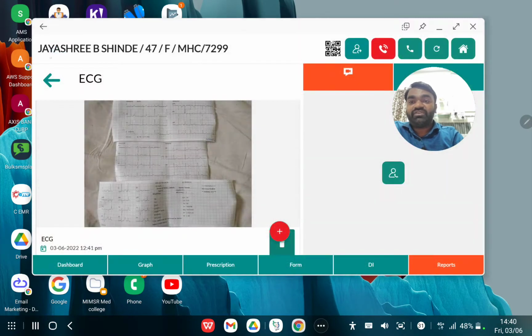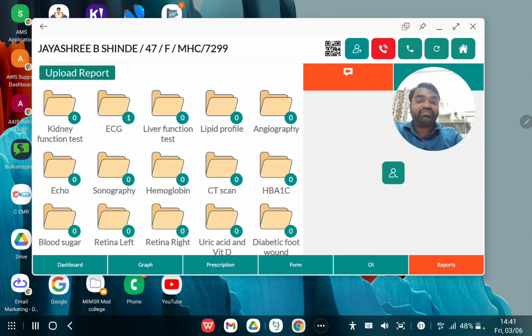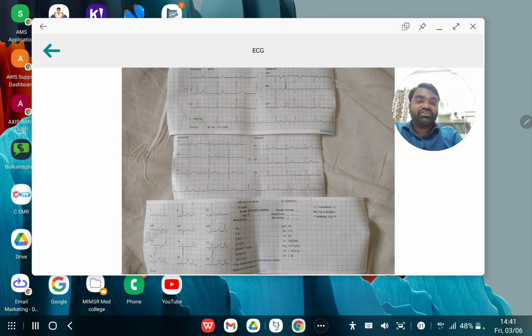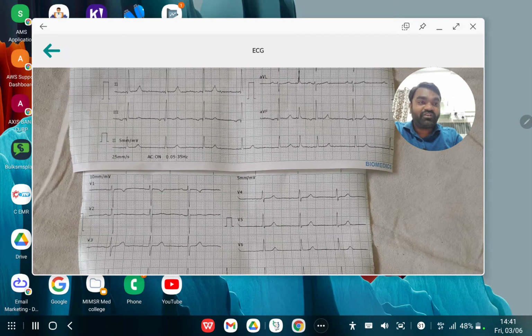Now, if you have seen, the patient is giving a history of giddiness, then we'll have to find out whether she is suffering from any other arrhythmia as well to have giddiness or syncopal kind of things. So this is a quite interesting case and interesting ECG to look upon, and this patient should be started on beta blockers, what I feel, and then observe her for her giddiness or syncope as well. So this is what for the patient for the time being. Thank you.